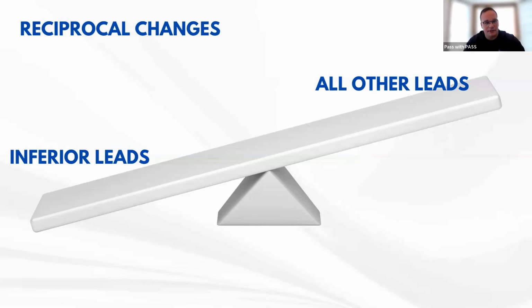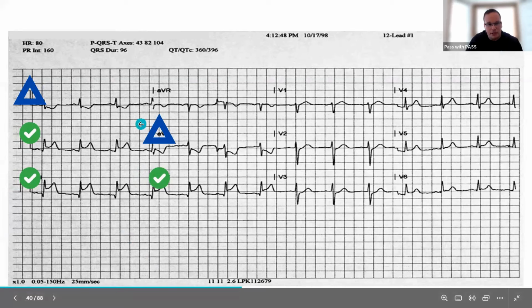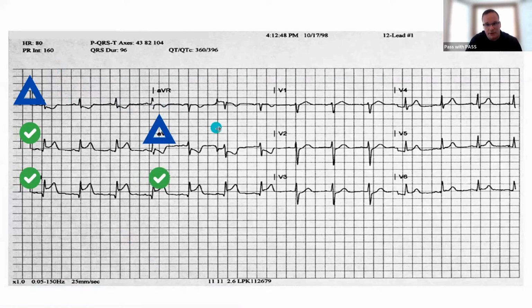It's just extra evidence. By no means does it have to be present, but there's a very strong chance that it will be. And so what does that look like? In this 12-lead EKG, we have ST segment elevation in 2, 3, and AVF, and I have reciprocal changes in 1 and AVL. So my high lateral camera, again, that's where I'm most likely going to see those reciprocal changes, if I do, for my inferior wall, because those cameras are looking at each other from opposite angles. I have ST segment depression in 1 and AVL.